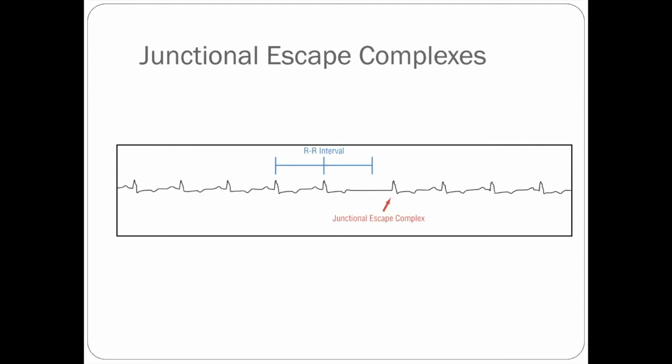So in this cartoon, you're seeing a rhythm that's initiated from the atria here that eventually goes into some level of a block or a pause. And again, the AV node is trying to prevent the cardiac standstill, so it takes up the firing with a junctional escape beat, and that junctional escape beat ends up potentially becoming the rhythm, or the rhythm will go back, just depending on what ultimately happens.